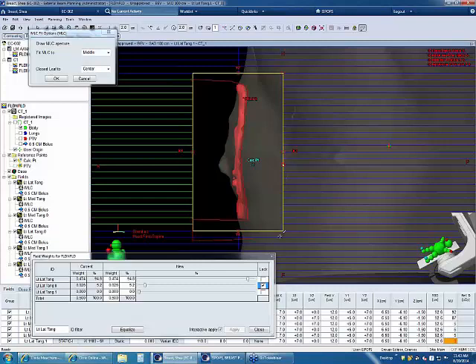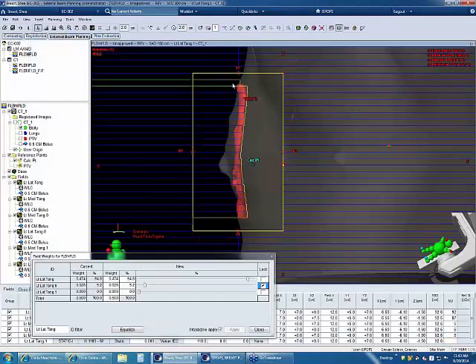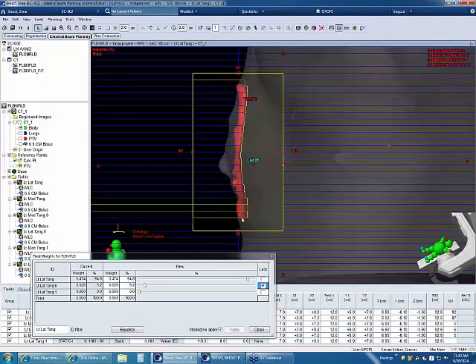And again, be as sloppy as I want coming back. Okay? Click inside here to set them all so I can just move one leaf at a time. And I can pull this one in a little bit, that one in a little bit, that one in a little bit. Okay? And I'm going to calculate.